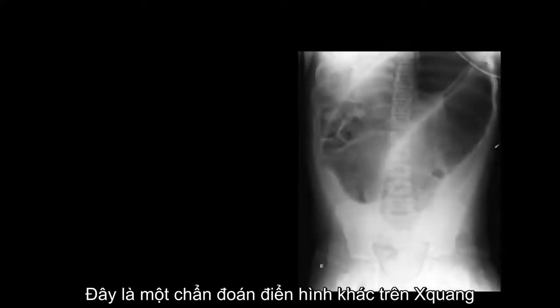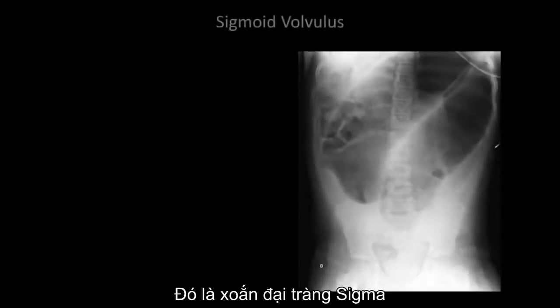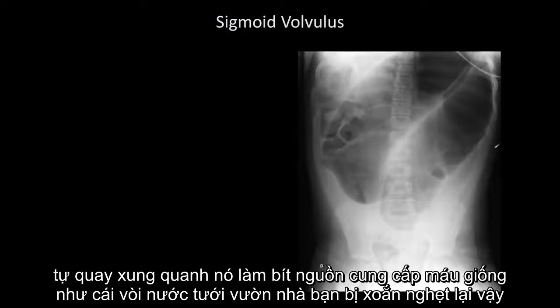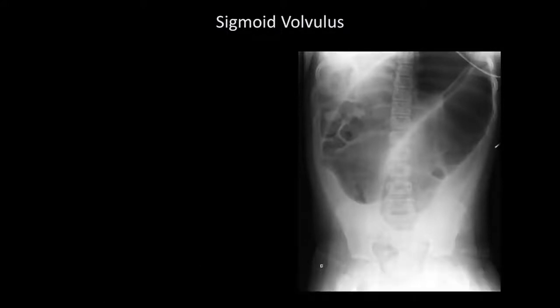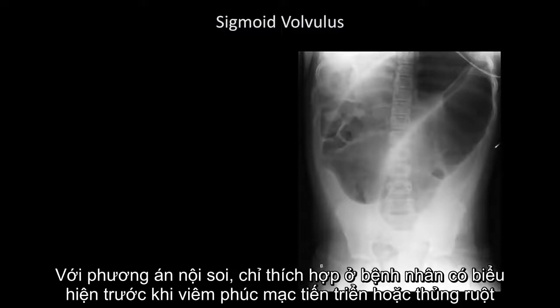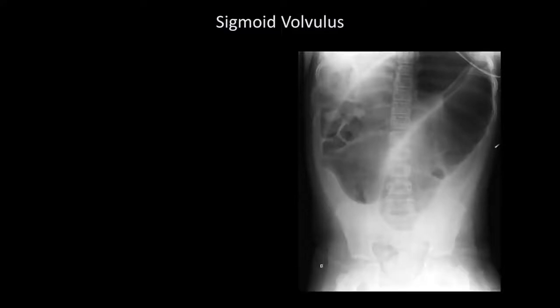Here's another classic X-ray diagnosis. This is a sigmoid volvulus. This is when the sigmoid colon, normally located in the lower left quadrant, rotates around itself, choking off its blood supply like kinking a garden hose. It is an imminently life-threatening diagnosis requiring emergent endoscopic or surgical management, with the endoscopic option only appropriate for patients presenting before the development of peritonitis or perforation.